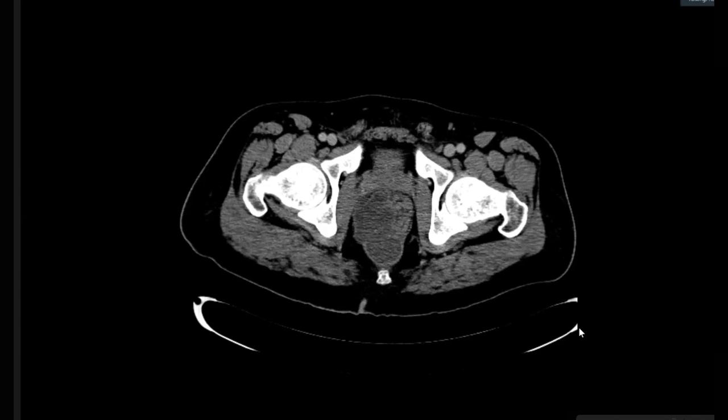What's more? Sir, there is no internal necrotic component or calcification. I cannot appreciate any septations or solid component. You said no necrotic component, and you say this is a hypodense lesion, so there is overlap between two terms.